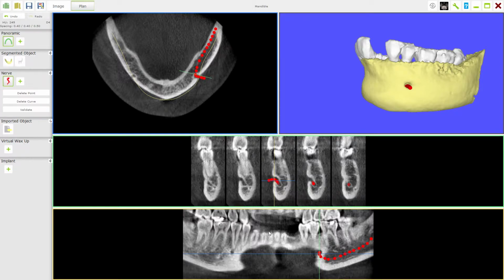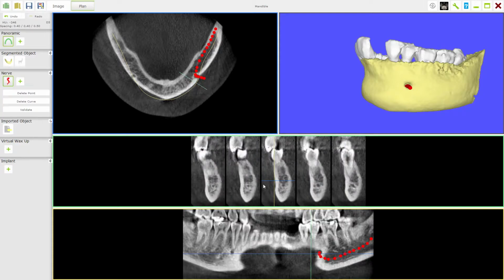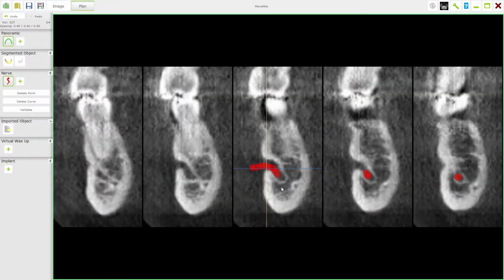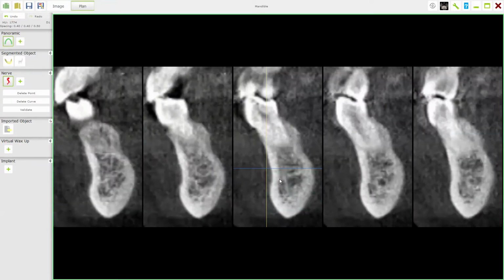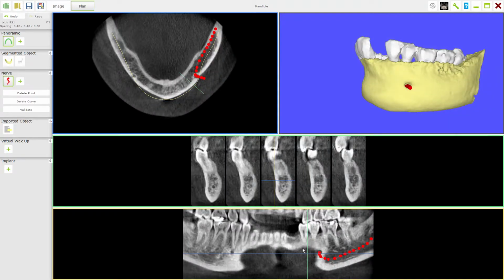Now obviously we need to think about planning where we're going to be positioning our canine. Now fortunately for us, we're not actually working anywhere around the nerve. So although I've traced it in, we're not actually working there. We could go further forward of the nerve, and if we wanted, we could trace the incisive branch. So we've got the mental nerve coming through, and then we come forward, and this here would represent the incisive branch, as we're coming round more towards our incisors and our canine and our first premolar. So we're not too bothered about that.